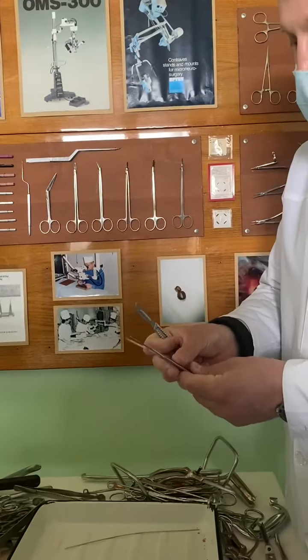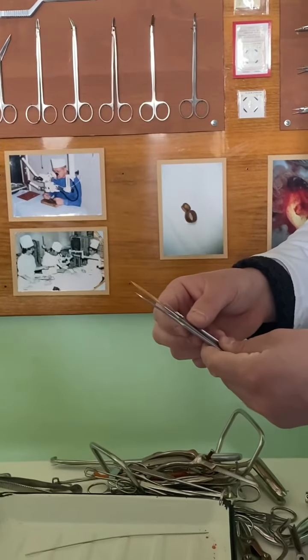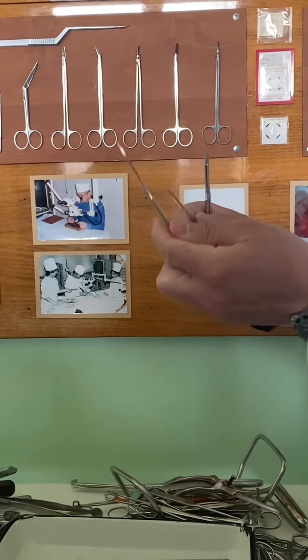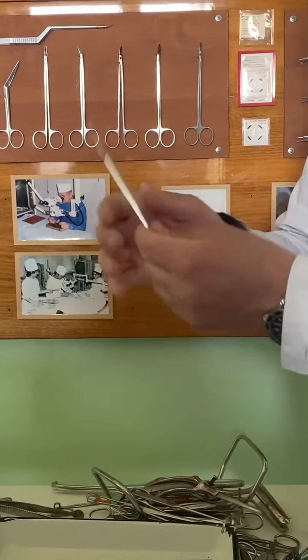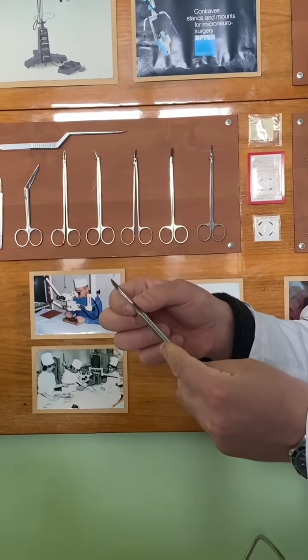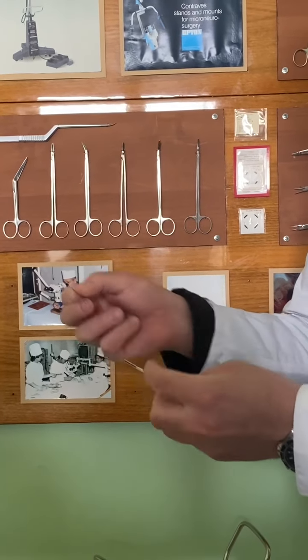Different types of scalpels. First of all, you should remember how we can hold it. 3 positions for scalpels. Here, a full metallic bellied scalpel. Here, a full metallic lancet-shaped scalpel. And here, the most modern and most popular version, the bellied scalpel with a changeable blade. The blade you can change.